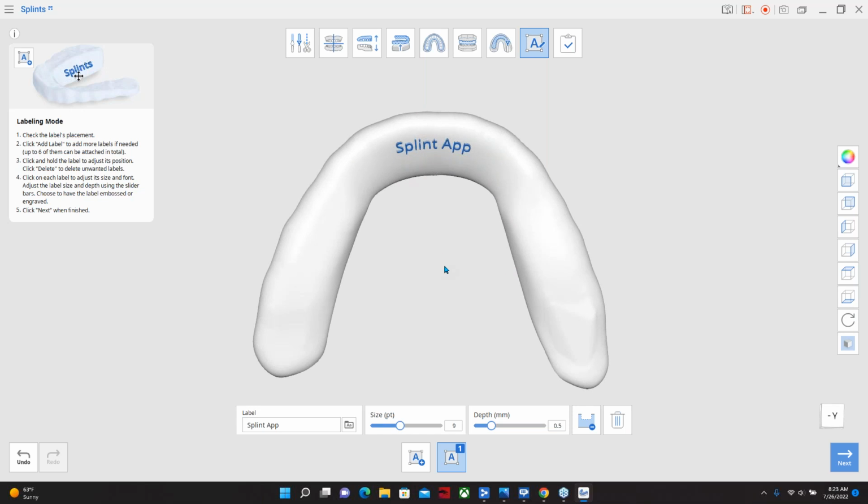Again, I just kind of want to touch on a little bit, that's what's really exciting, is the beauty of the automation here and the auto creation, how quickly this happens. And the fact that you're seeing the AI, artificial intelligence coming out when it comes to placing the model on those occlusal planes and how quickly this process is becoming. As I mentioned earlier, Medit is really focusing on creating an ecosystem that's very, very simple and easy to use in the clinic. And it also helps you with case presentations and so forth.